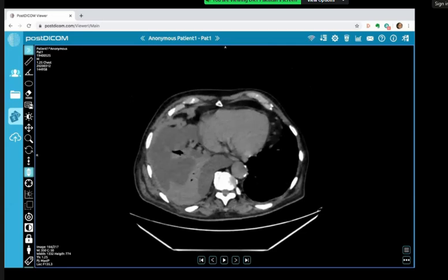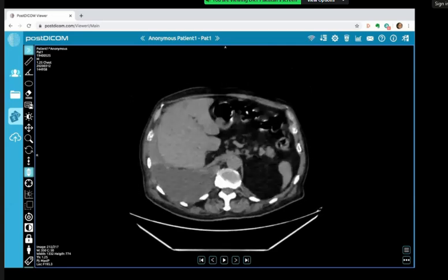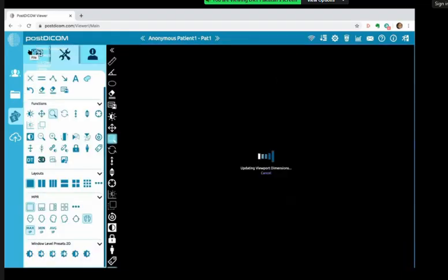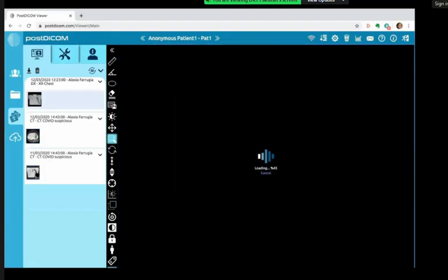Okay, so as suspected on the X-ray, there is diffuse continuous pleural thickening involving the right hemithorax with involvement of the mediastinal pleura, a large pleural effusion, and underlying collapse and consolidation of the right lung, with very scarce aerated right lung.